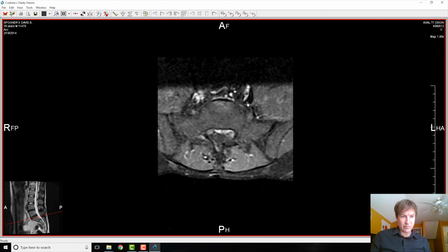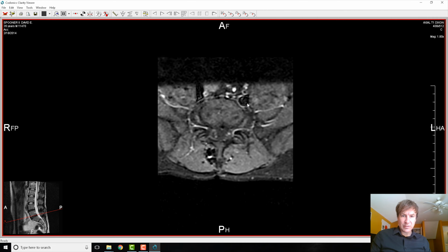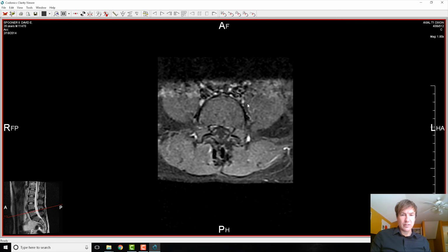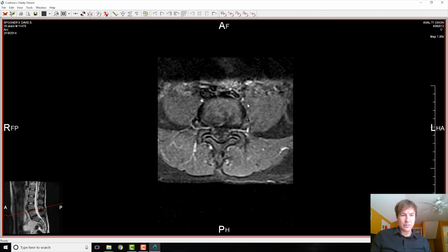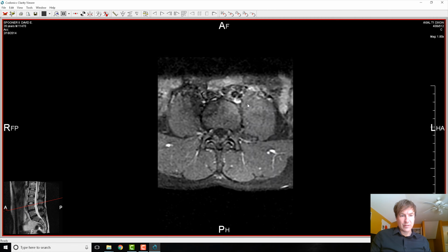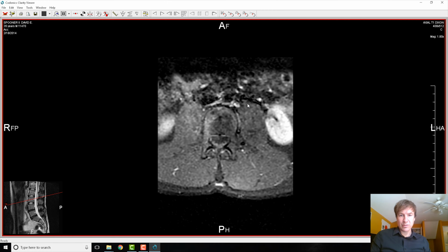Just now getting to the L5S1 disc, L4, L5 disc, L3, L4 disc.